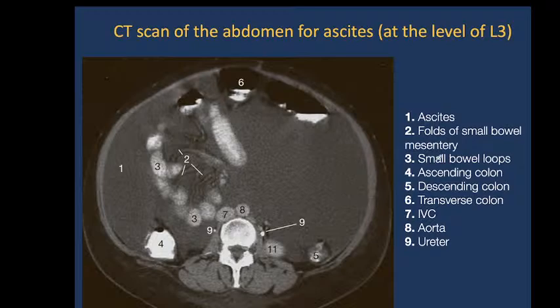Here is the pathological process called ascites, fluid inside the abdominal cavity during portal hypertension, when after a pathological process in the liver, liver tissue transforms into connective tissue, and it is not possible for blood to come into the liver, so it comes out of the veins and fills the abdominal cavity.